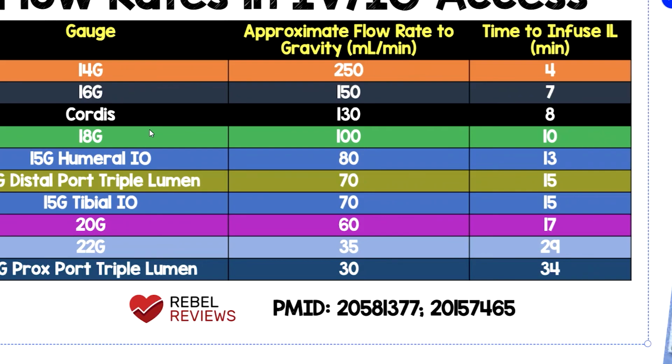So it really depends on the age group you're dealing with and the volume that you might need to administer. The standard medical angiocath for an adult happens to be the 20 gauge catheter. We're not looking to infuse a lot of volume for a medical patient, 200, 300, 400 mils, maybe even 1,000 mils, depending on what we're dealing with, but not usually a trauma patient.